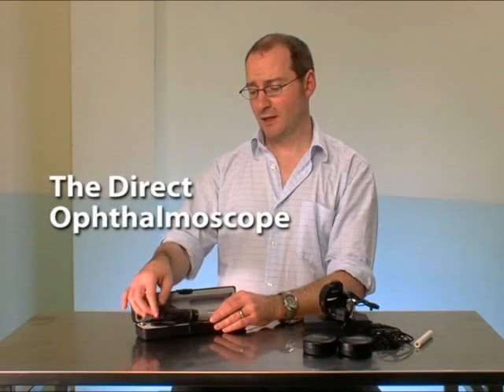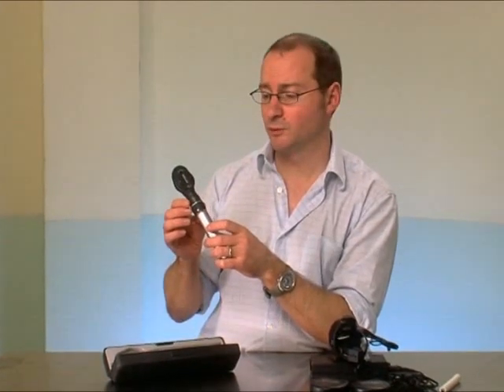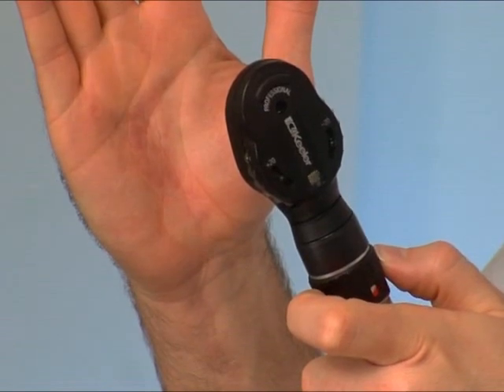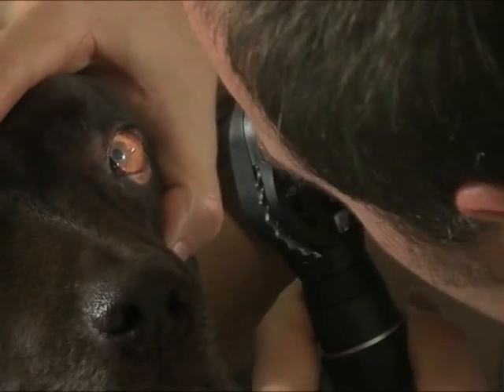The direct ophthalmoscope has a number of features which it is worth familiarising yourself with if you are going to use it. First of all, there's the on-off switch, which is combined with a rheostat so that you can control the intensity of the light emitted, and so as you turn it on you can gradually increase the power and the brightness of the light source. It's important to control the intensity of the light beams, particularly if you've got brand new batteries or a recently charged ophthalmoscope. It is a very bright light, and for any of you who have had an ophthalmic exam, you'll know what it feels like. It's mainly to do with patient comfort.